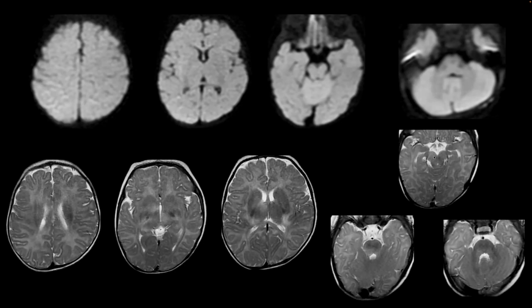Coming down inferiorly, the mammillary body is also slightly hyperintense. The midbrain is slightly edematous. The cerebral peduncles and the dorsal brainstem demonstrate T2 hyperintense changes. There are no corresponding changes on the diffusion-weighted scans, so predominantly T2-weighted abnormalities were there.